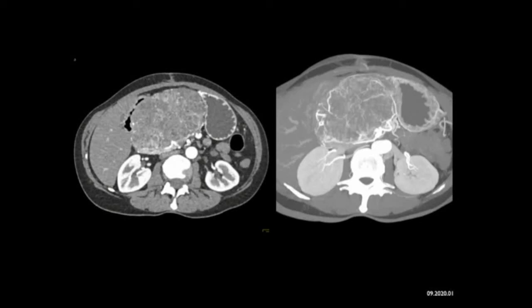And then you look at the choices. Lymphoma. Lymphomas are typically hypovascular and solid masses. Similarly, GIST tumors can be somewhat vascular, but this is too much vascularity, and particularly the stranding in the periphery of the lesion, that stretching of vessels. Neuroendocrine tumors are vascular, but not with this appearance. They're usually hypervascular centrally, and this would be a large neuroendocrine tumor, which are typically very vascular.